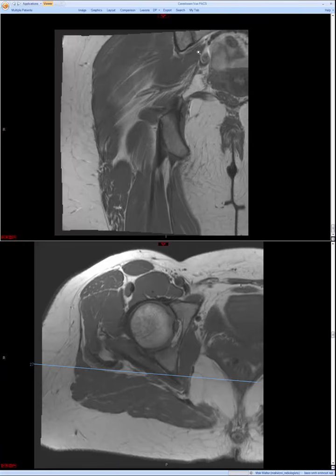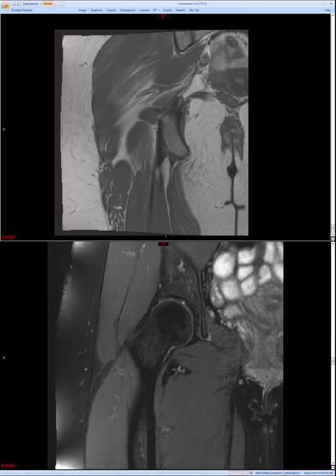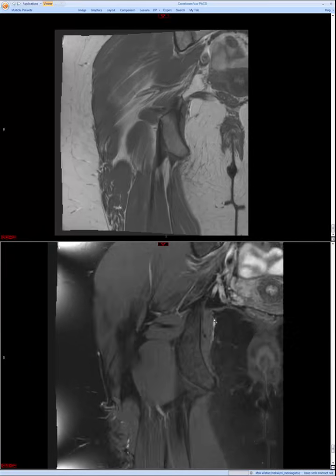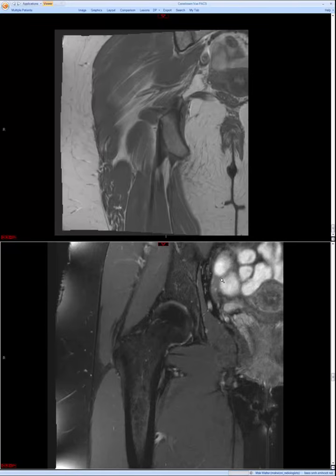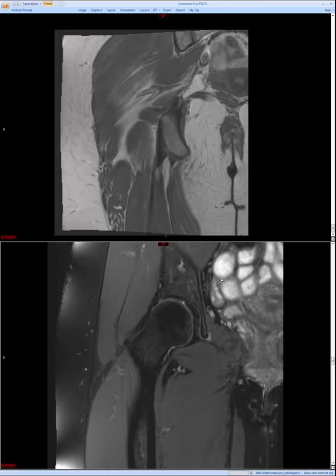So you can imagine, for example, if we have a young patient with undiagnosed hip pain, quote-unquote hip pain, and in fact it's actually low back pain, and they have inflammatory sacroiliitis, you might actually see some features of that there. And of course, you won't see it well enough to make the diagnosis, but you will see it well enough to be responsible for at least noting it and directing the clinician appropriately.